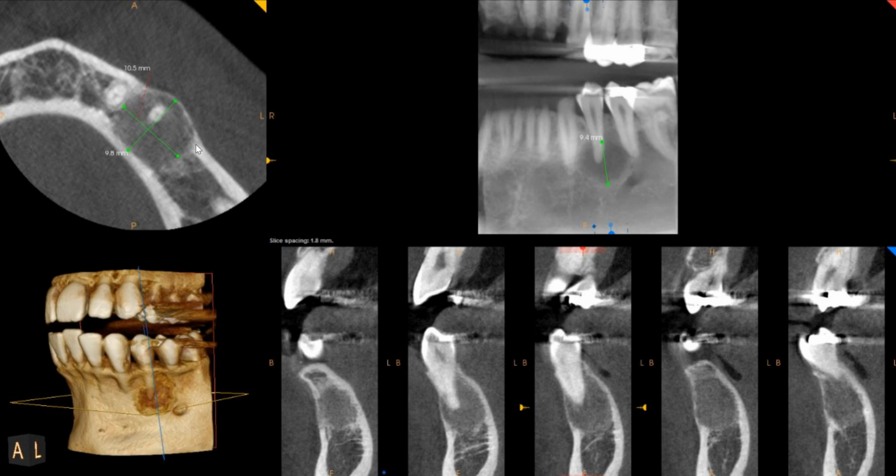But what I want you to see is this thinning of the buccal cortex and expansion of the ridge, right? Another thing that I can't quite tell, since I don't have the scan, is whether this has displaced the tooth buccally or lingually. At least from this view, I don't think there's any evidence of gross resorption, because the overall root length and the root morphology look very similar to tooth number 19. Excuse me, number 20.